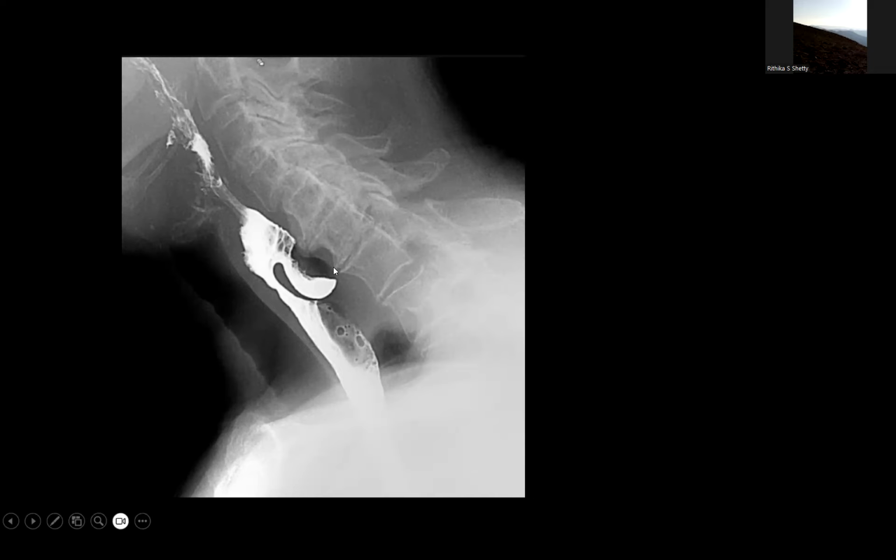Whenever we see the outpouching or the diverticula in the esophagus, we have to remember that we have upper, mid, and lower. Lower we know epiphrenic. Mid, most common is traction. So this is upper esophagus near the cricopharyngeus. Here we are having only two, either it should be Killian's or Zenker's. Since it is next to vertebral body here, we know it is posterior. So posterior most common is Zenker's diverticulum.